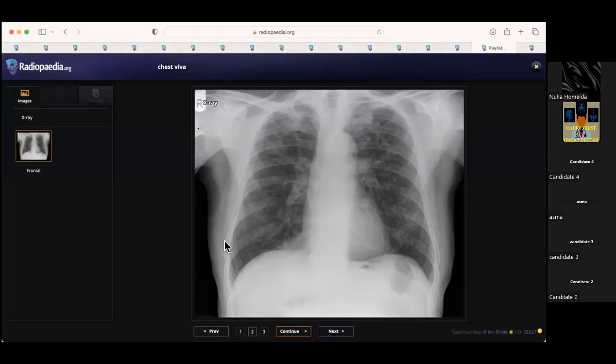And so what's your diagnosis? Yes, these are the diagnoses for reticulonodular shadowing. It could be due to interstitial lung disease. It could be due to an infectious or inflammatory process. I will carry this further by doing a high resolution chest CT scan for better assessment.